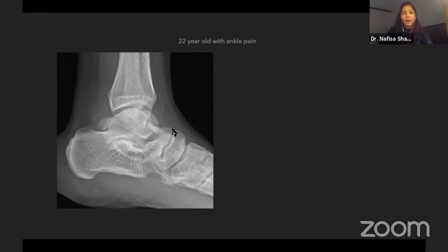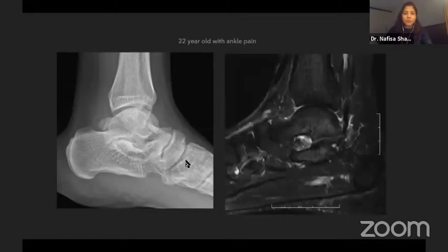But in a young patient, whenever we look at anterior talar beaking, it sets our search for what is happening, because most likely we are missing a coalition. In this case, we weren't too sure, but the MR easily shows us the calcaneonavicular coalition. In this case, you can see that facet there. So this was a fibrous coalition, a calcaneonavicular coalition.